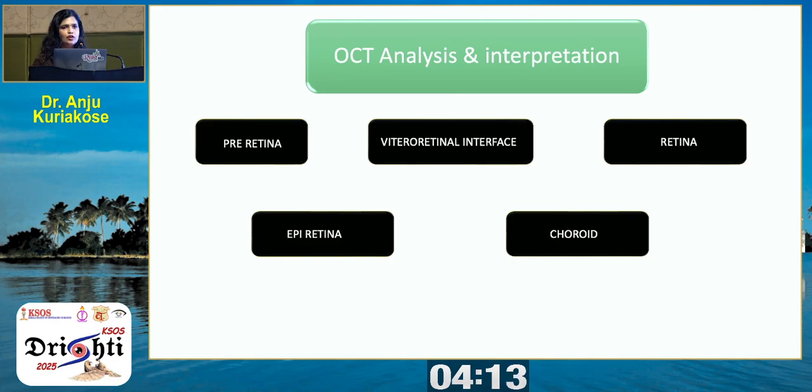Next, we have learnt about the nomenclature. Now we will see what the layers are, what the normal layers are.